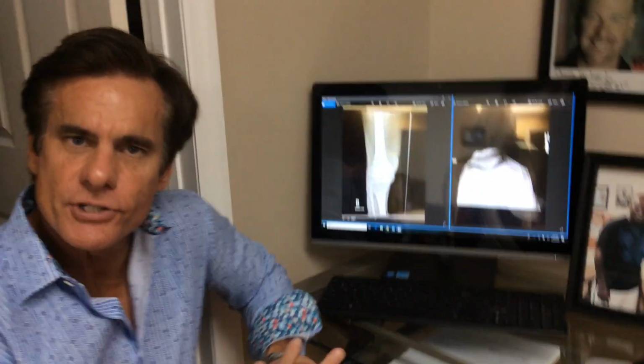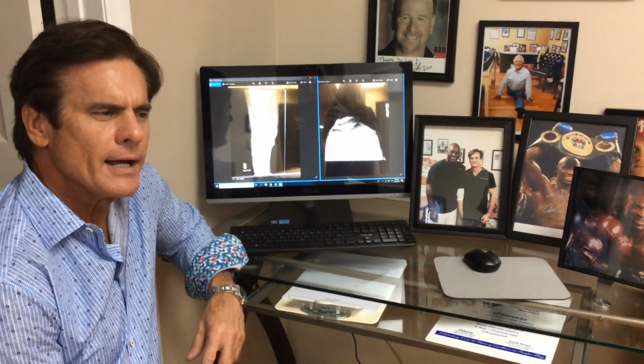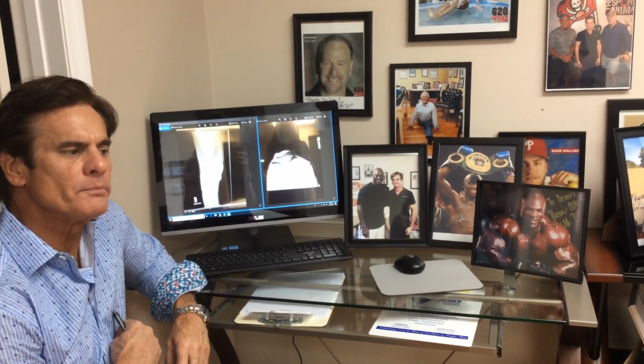This patient is not your typical patient. He developed polio in 1953. I believe the vaccine was in '54. And so you don't usually see polio patients. His left leg is paretic, and he has a knee and ankle foot orthosis.